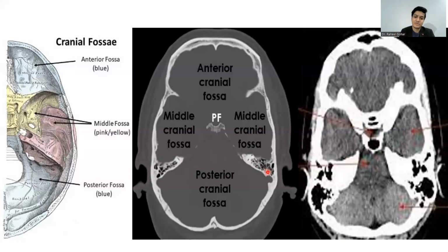So this is the mastoid part of the petrous bone. Then posterior to the petrous, we have got the posterior cranial fossa. Here you can see these structures here in the white color. These are actually the tentorium cerebelli, because the tentorium cerebelli is attached to the petrous bone and then finally to the posterior clinoid. So as I have already told you, this structure here is the posterior clinoid, this is the petrous bone. So the tentorium cerebelli attaches here. So this here we can see as well. Again, this is the sella turcica region where the pituitary fossa is.